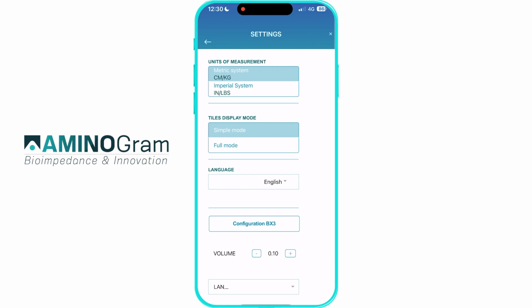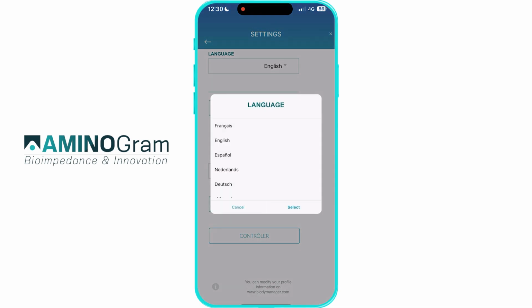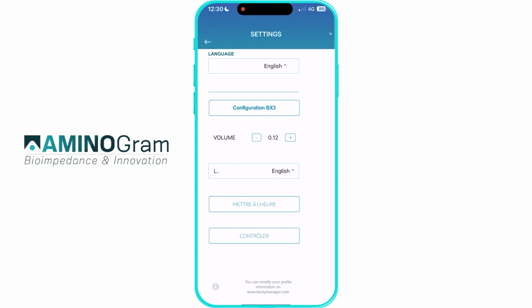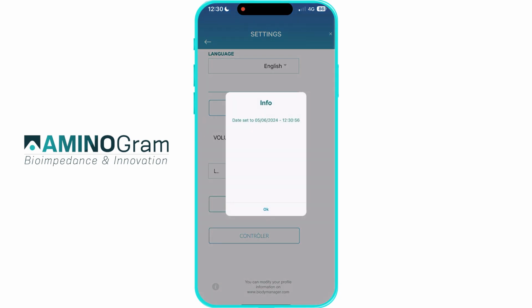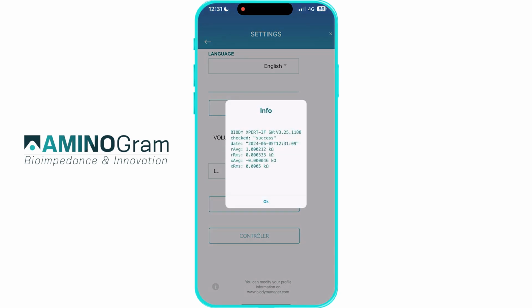You'll have access to a range of settings. You can adjust the volume of your device, change its language, set the time if you're in a different time zone. Lastly, you can check the status of your device. If it reads success, everything is functioning perfectly.